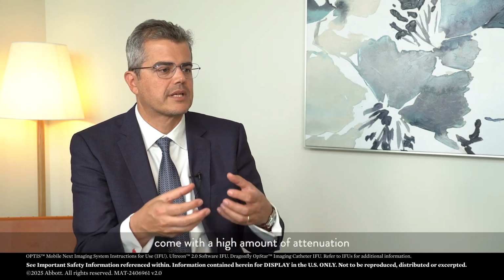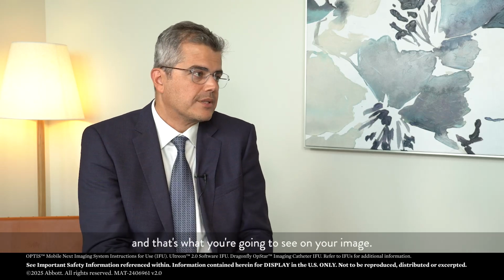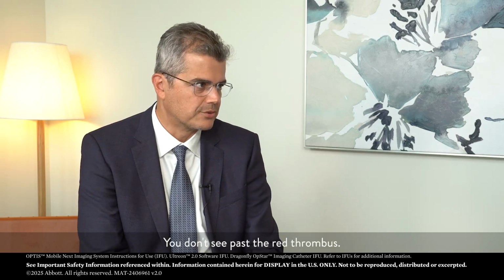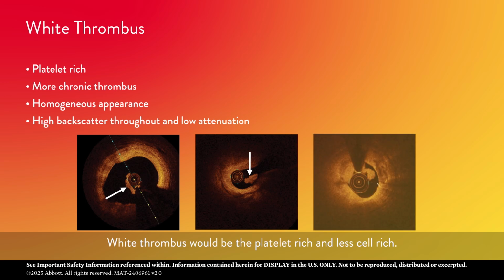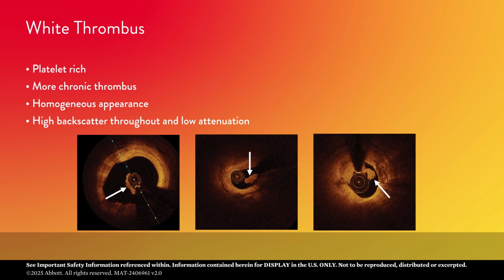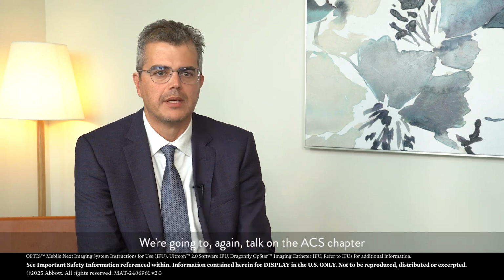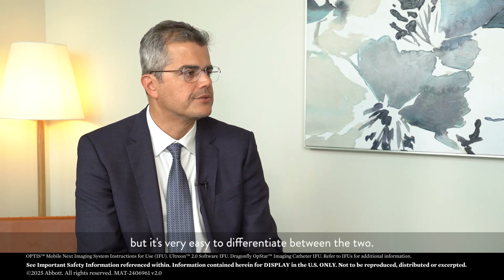So red thrombus comes with a high amount of attenuation, and that's what you're gonna see on your image. You don't see past the red thrombus. White thrombus would be the platelet rich and less cell rich, and then you can see through it, right? And what's the clinical relevance of this? We're gonna again talk on the ACS chapter, but it's very easy to differentiate between the two.